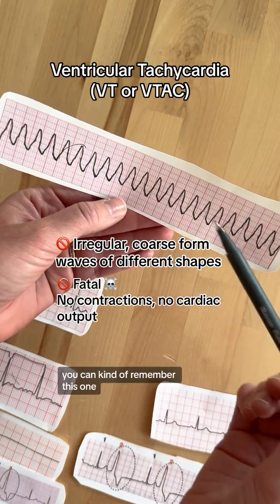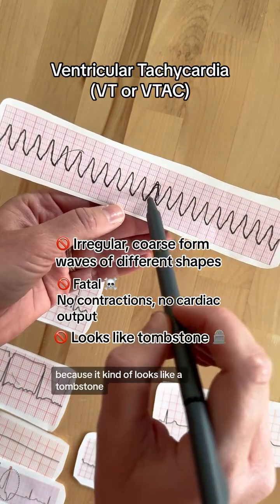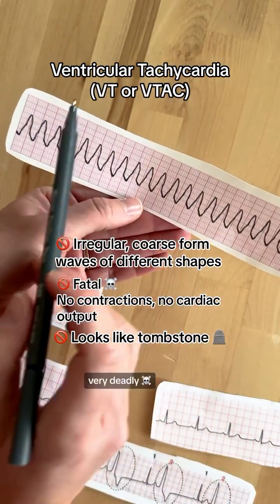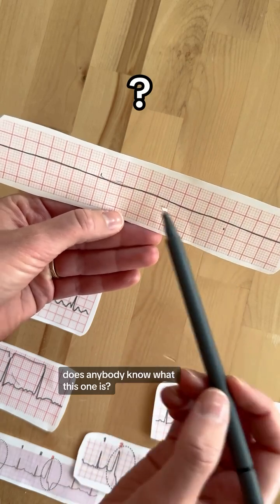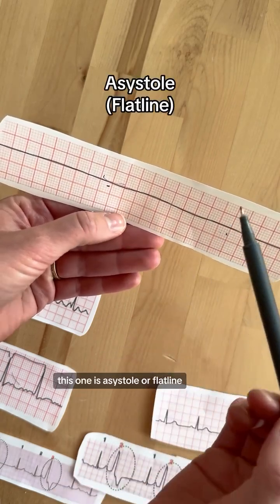You can kind of remember this one because it kind of looks like a tombstone, and VTach is again very deadly. Okay, this is our next one. Does anybody know what this one is? This one is asystole or flatline.